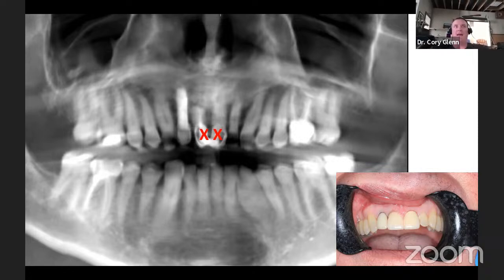But once you have that, everything is in your BlueSkyPlan file. You've now got the roots that you can turn on and off individually. You've got the maxilla and the mandible, which have accurate sockets of where the extractions are going to be. So now you can just jump straight into designing guides or doing whatever it is that you're doing in that case.